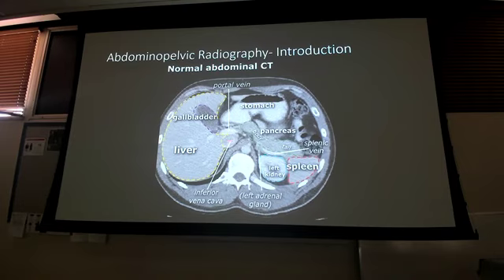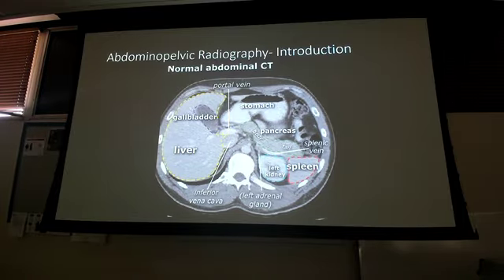That's not the esophagus. How do I know it's not the esophagus? I'm halfway down through the abdomen. It doesn't go that far, right? So don't get that confused with esophagus. How do I know it's not trachea? Well, A, it's not in the lungs, right? But it's also not filled with air. So know your anatomy.